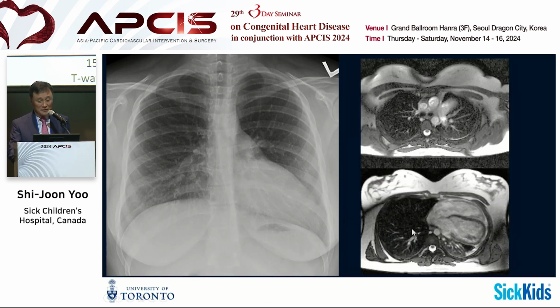So what it is in this case is that in the MRI or CT, there is a very, very subtle finding. This is the main pulmonary artery, this is the ascending aorta, this is the superior vena cava. Normally, surgeons know well, there is pericardial coverage here. So therefore, lung tissue cannot be between the main pulmonary artery and ascending aorta, but in this patient it is invaginating, which means that there is no pericardium in this location.